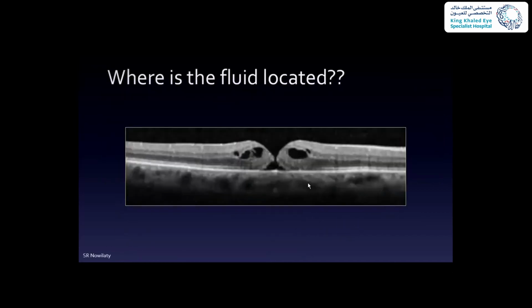Now let's look at this one, and I'm going to ask you to tell me where the fluid is located. Where is the fluid here? What would you call this fluid? I'm waiting for your answers. This is really fun, guys. So where's the fluid here? Subretinal fluid, absolutely. And where's the fluid here?